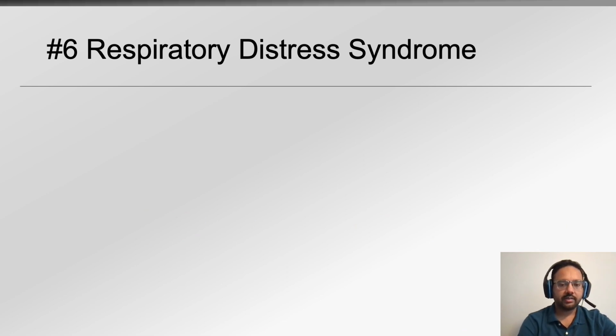And then finally, I want to wrap up with two diagnoses that are not very pertinent to my practice, but are very useful for my neonatology friends. And if you take care of neonates, these may be very helpful. So the first one is respiratory distress syndrome.